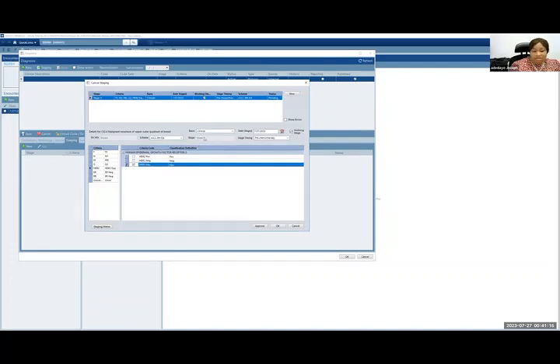So the point I'm trying to make is that once you see a stage X, it is because you have not completed every aspect of the staging. So again, this is showing a 3B. If I went to Oncotype DX and I removed it, it will go back to a stage X. So once you don't fill in every aspect of the staging, it will show you a stage X. And what do you do in that situation? Let's assume this patient is HER2 equivocal, and we're seeing a stage X. We simply don't know. We don't have FISH yet, and we cannot confirm yet what her HER2 status is.